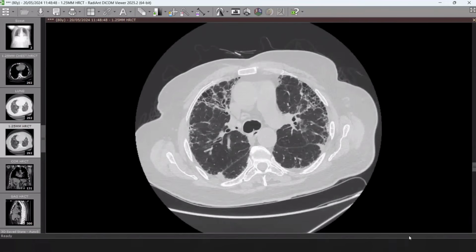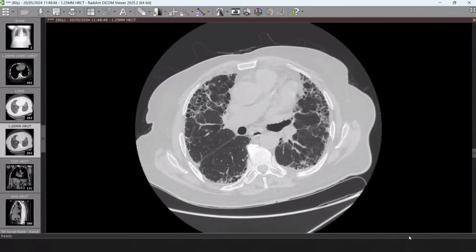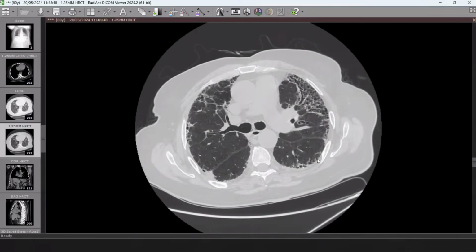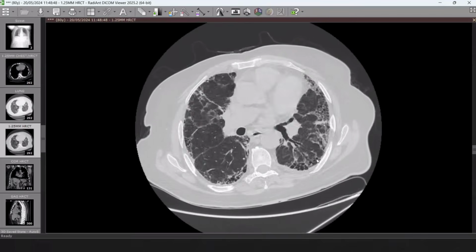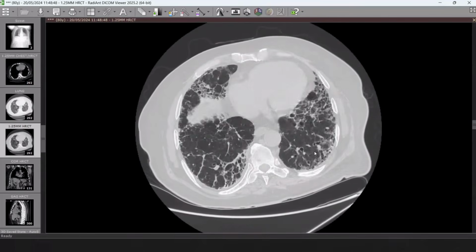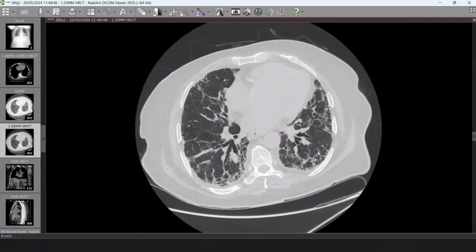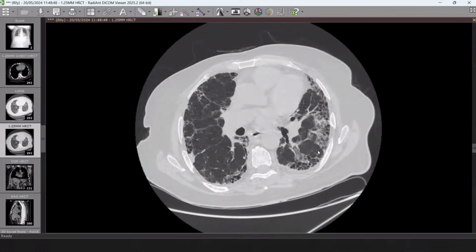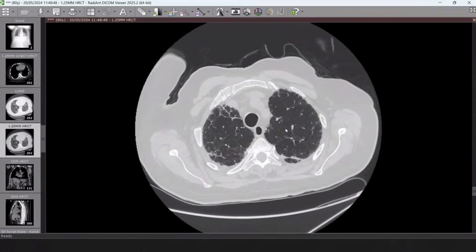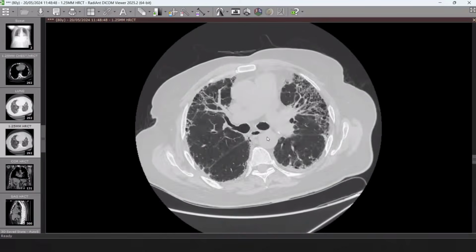Let's enumerate again. You said that we have interstitial septal thickening. I would like to make it more precise. We have interstitial reticulations, because it's not interlobular septal thickening. It is coarse reticulations, with an apico-basal gradient: the apex is least affected and the base is most affected.